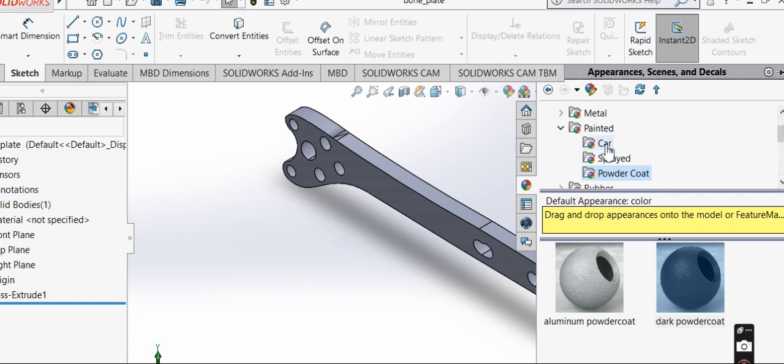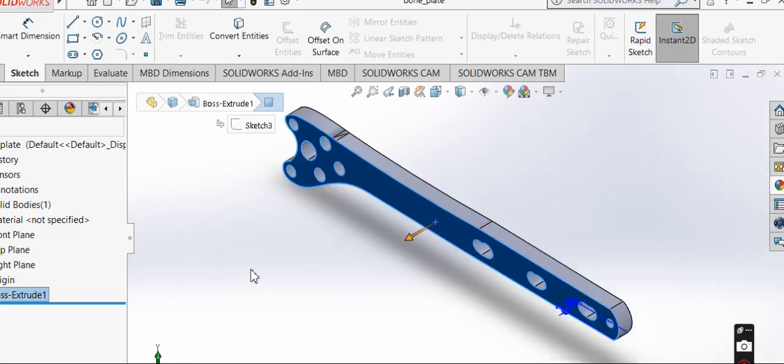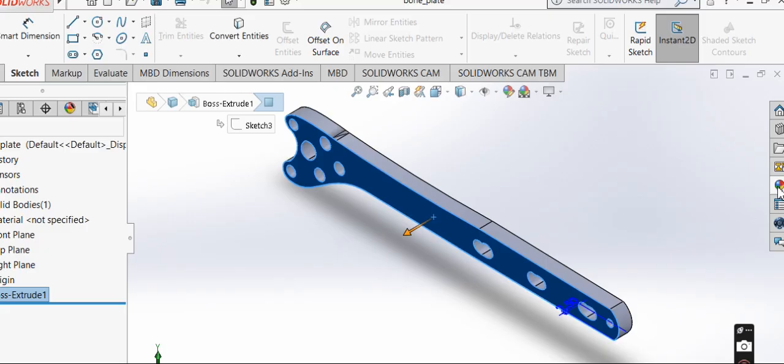So you must use a material that will cause lower stress, and use boundary conditions that will cause lower stresses.